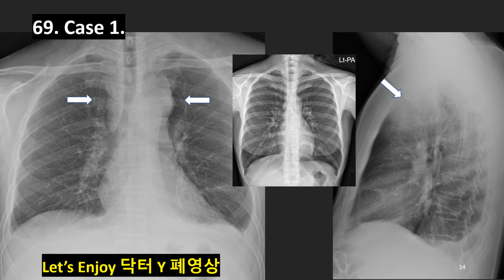Mediastinal widening, bulky widening. On the right side, disruption of the right paratracheal stripe and bulging contour, and on the left, disappearance of the AP window line with bulging mass. We also see bilateral pleural effusion. On the left lateral film, we see retrosternal obscuration and pleural effusion below.